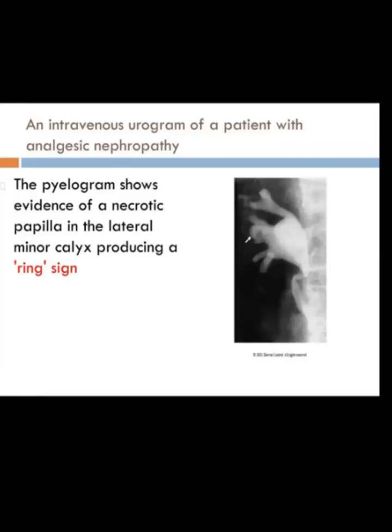The rim sign is in cortical necrosis because whenever there is too much ATN or dehydration, or pregnancy-related AKI, all the blood supply of the cortex is cut off, but some of the cortex just beneath the capsule is alive due to the penetrating vessels from the capsular area. So it leads to a viable rim in the cortex that is known as the rim sign in cortical necrosis.